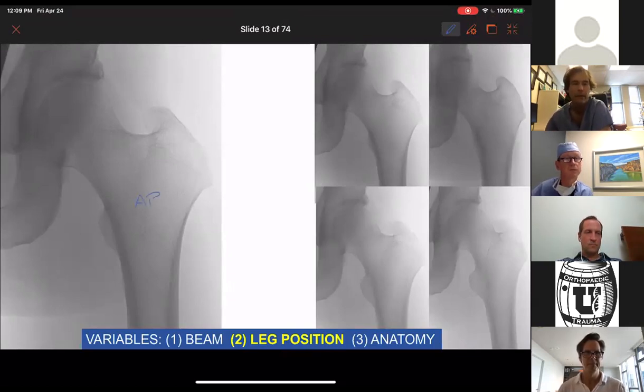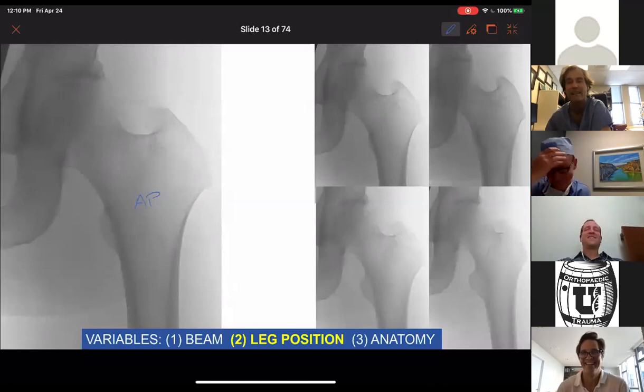After perseverating last night, I met one of the x-ray techs early this morning and got a bunch of x-rays of my femur in different rotations. She thought I was kind of strange. I was blocking my junk though, so you won't see that in any of this. So, all right, so on the top, let's go up here.